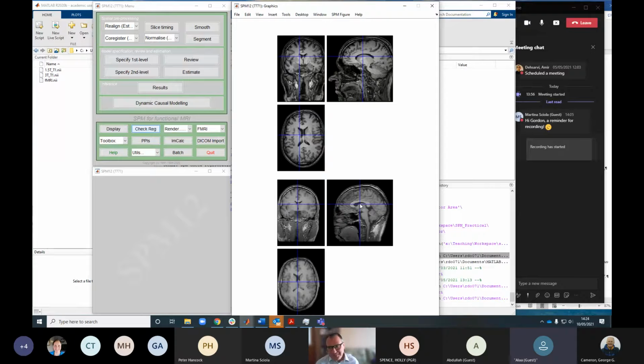The orientation? Well, their orientation is the same. We still have coronal, sagittal, and axial. No, sorry, the blue lines. It's just not in the same position. Yeah, they're not quite co-registered, so they're slightly off. Yeah, so we've got a few. So position when the frame is different. Yeah, got a couple of suggestions.